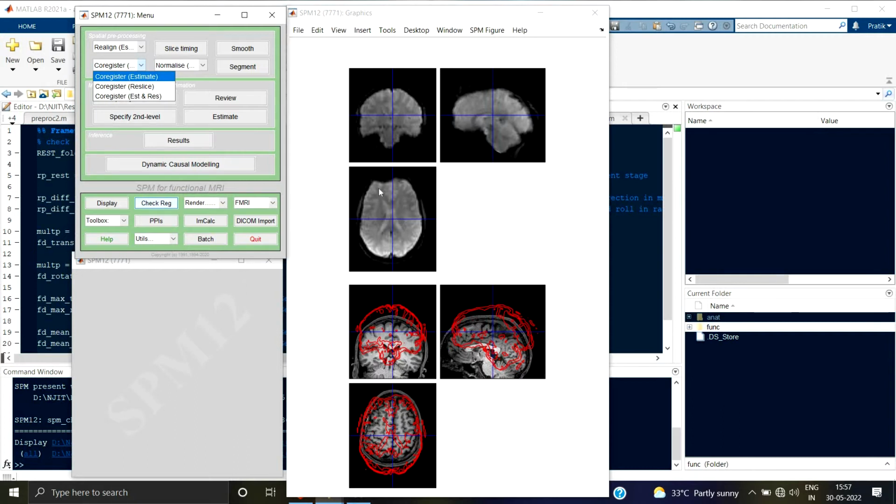So the source image will be warped or moved according to the reference image, so that these two are aligned. Here you can see that we want to move this below. If this particular image goes down, only then can you align these two, right? That is the task.